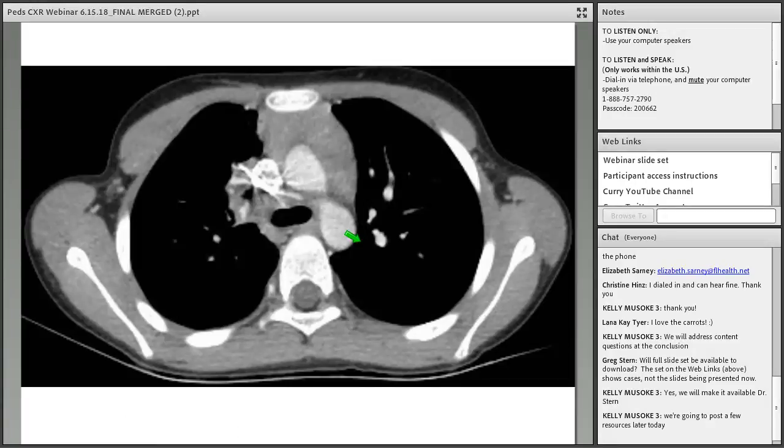This is the CT of that same 7-year-old patient. Again, you can see that there's an anterior adenopathy, which we were not able to see before, although in this case the differential also includes prominent thymic tissue, which I think in this particular case is a combination of thymic tissue plus some adenopathy there.